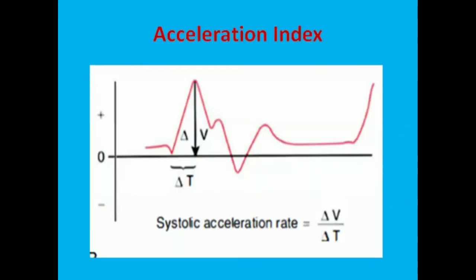Acceleration index is also used for quantitative measurement of the acceleration. While acceleration index is much less used in practice, it is a simple ratio of the difference in velocity from the start up to the peak systolic, and the difference in time which is taken by the acceleration.